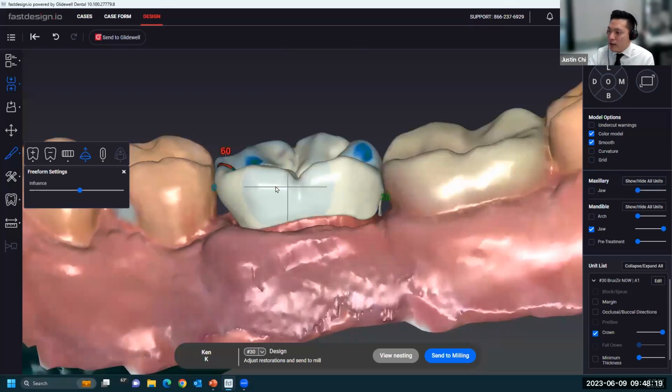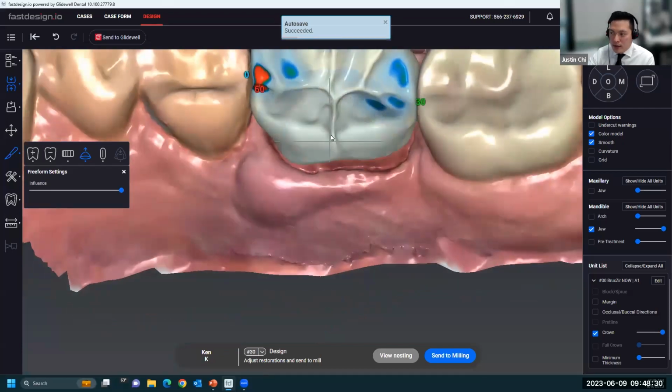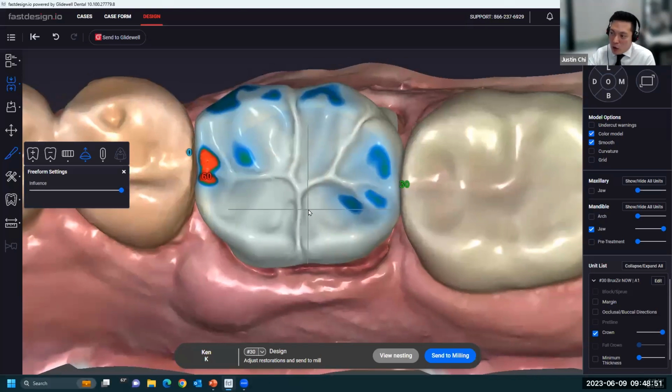Now, looking at the lingual cusp tips, you can see it's a bit low compared to at least 29. So here, I often like to have the lingual cusp tips a bit higher. And as you're getting into the design game, you can find your favorite morphology book or check online for your ideal design contours and shapes, and have it next to you and just kind of double check that your design is going according to plan.